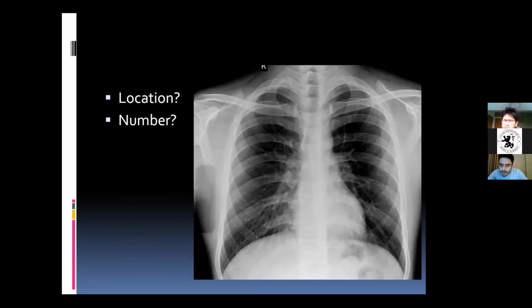Why would you say osteomyelitis? Where can you see evidence of osteomyelitis? Okay, fine. But where? And also, wouldn't osteomyelitis display inflammatory symptoms? Would it not display fever? Would it not display systemic kind of pathology as well?